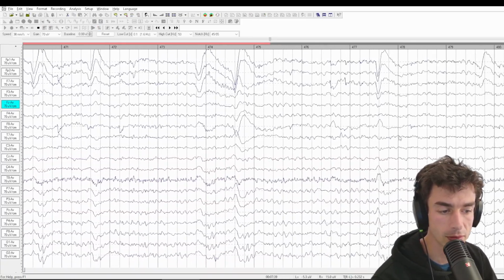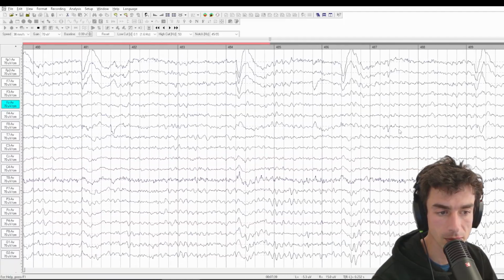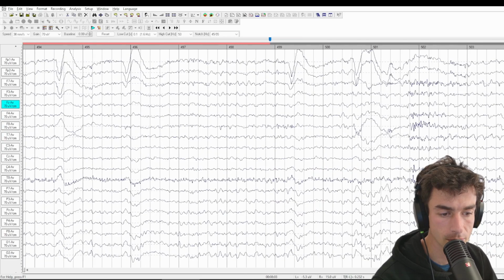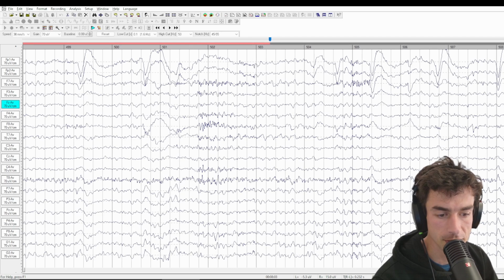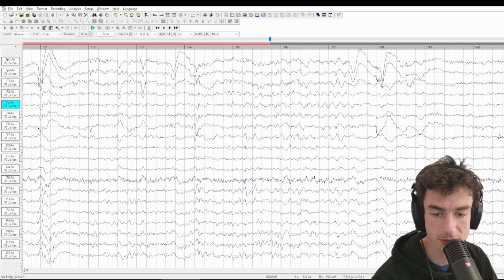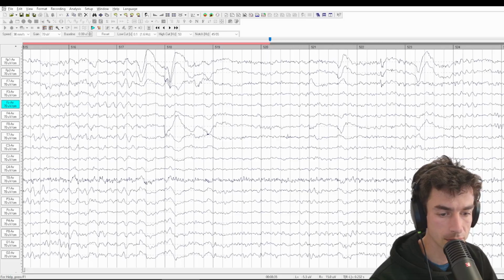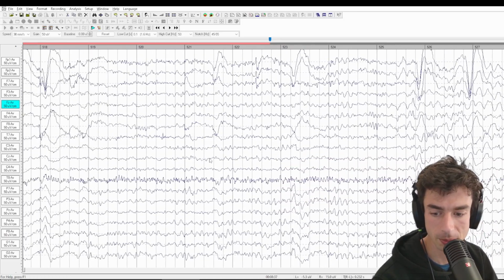Lateral eye movement. Muscle tension. Lots of lateral eye movement. Kind of a dropout in the background power.